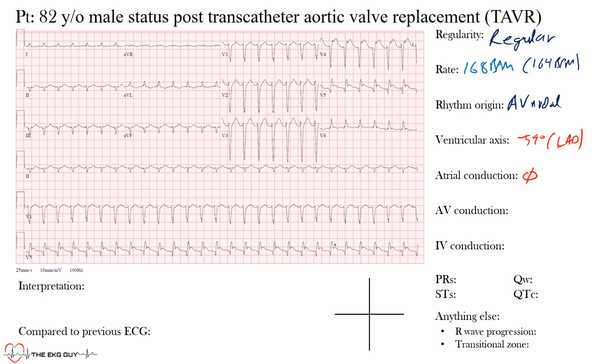Now what can happen with these junctional rhythms is that, imagine here, they're originating from somewhere in this region. They can conduct down towards the ventricles, but also retrogradely. And because it happens almost simultaneously, you may see retrograde P waves with an abnormal axis as it goes the other way. Now, because this is a regular rhythm, there's no irregularity to the ventricular complexes. We won't say anything about any drop beats or anything here. So AV conduction, we'll say, is pretty normal in this case, okay?